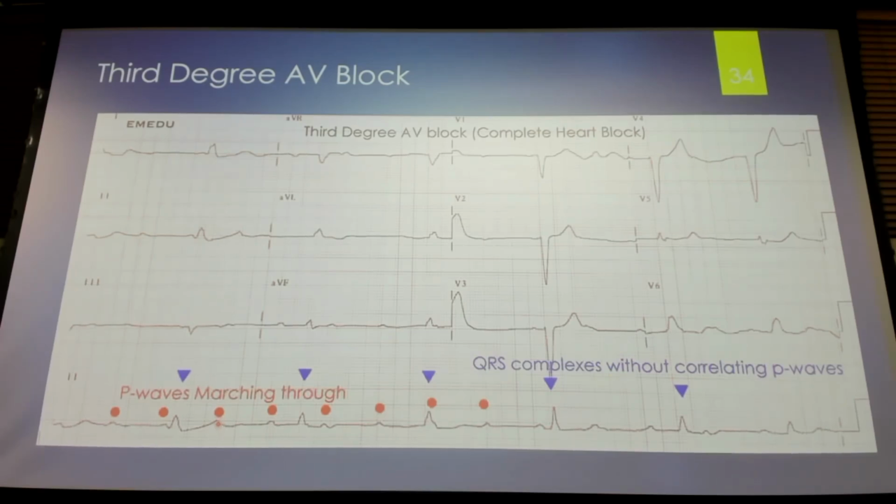Okay. It doesn't matter though. The T wave, we like to see it because it gives us a sign that this is definitely normal, but if you don't see a T wave, it doesn't necessarily mean anything, especially in the setting of a third-degree block. You know the heart is not functioning. It's probably not repolarizing well because there's a block between. So the atria are repolarizing by themselves, but the whole AV here is not. So you're probably not going to see much of a T wave.